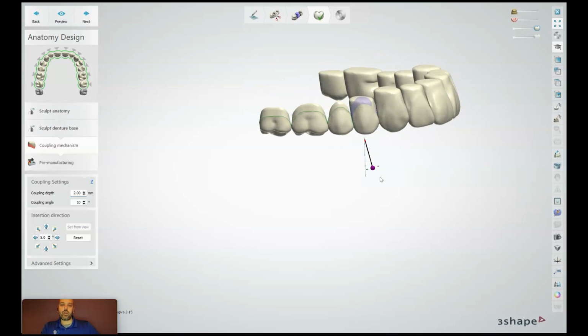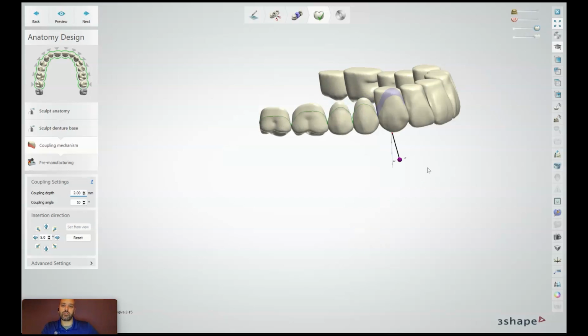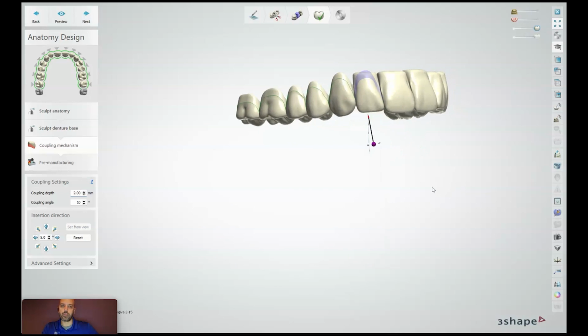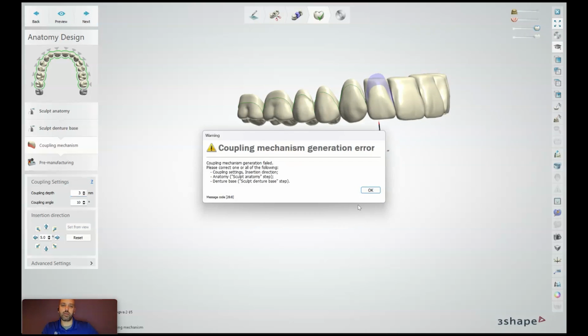You can also go in and edit the material file that you're using and change this coupling depth to 3 so that you don't have to change it on each one. And then as I go around, I'll position those, set my 3, and go.